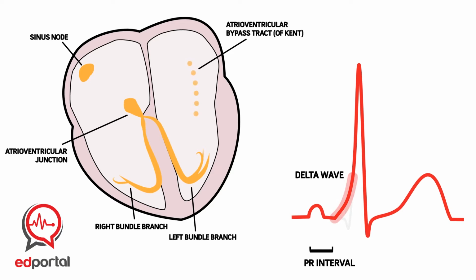They're usually very asymptomatic at this stage. So this could be an incidental finding, or the patient comes post syncope to the emergency department and now they're in sinus rhythm. You can see these ECG features. So let's see what happens when they go into SVT.